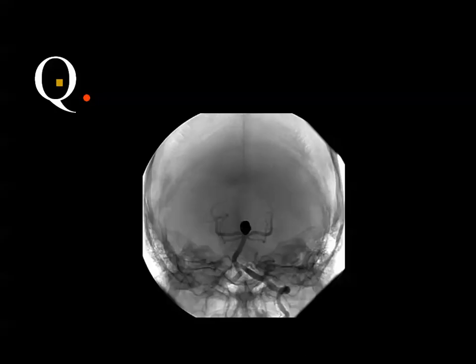This is angiography, selective angiography of the vertebral artery, showing an aneurysm of the tip of the basilar artery, and this aneurysm contains coils. You see the difference between the aneurysm content and the density of the artery. These are metallic coils, meaning that it has been occluded by intervention. The aneurysm of the tip of the basilar artery represents about 50% of the aneurysms occurring in the posterior circulation.